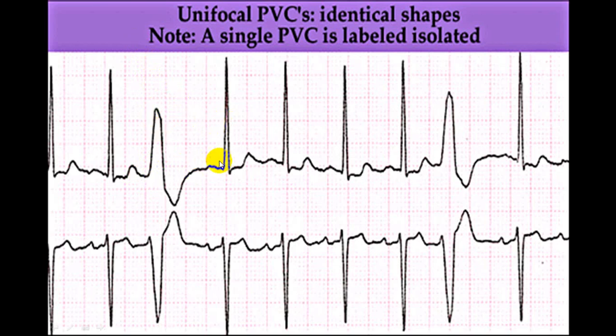Now during this particular period, as there is a good diastolic period, the ventricle is filled up and this will produce a large volume pulse. So normal pulse, missed beat, followed by a large volume pulse, characteristic of a unifocal premature beat. And as it has come from the ventricle, we call it a unifocal premature ventricular contraction. You can see both are of the same shape. That's why we call it unifocal. They are coming from a single focus.